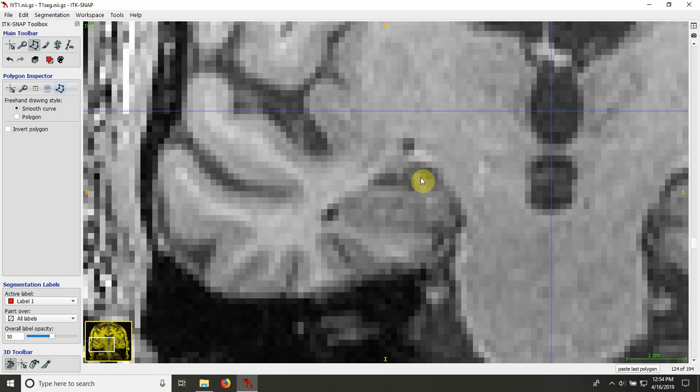And here this uncal region or vertical digitation is actually separated from the gray matter by these darker voxels, and they're not quite as dark as some of these voxels, which is probably because of partial voluming, but this is CSF. So I'm going to outline the border with the lighter appearing white matter, go to the most medial points. I'm going to include this portion, and there we go.